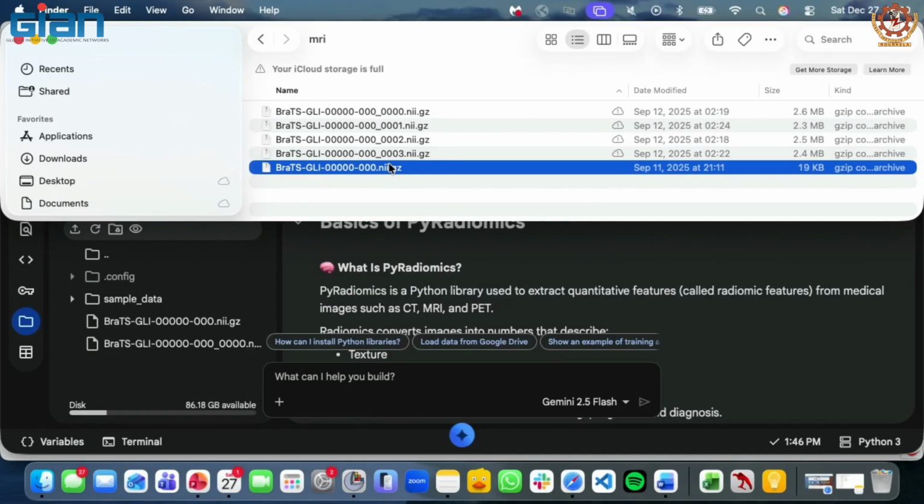As of now, we just discussed how to visualize medical imaging. Here, actually, we are extracting some features which can be used for downstream machine learning and deep learning applications. So this step is very important. Yes, just the first and the last.